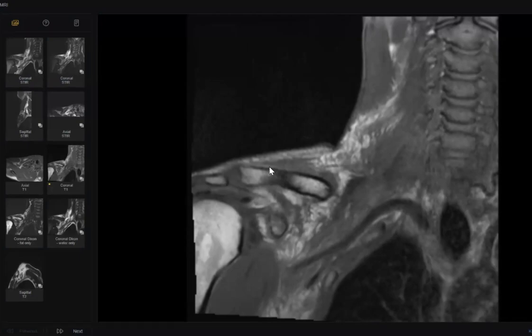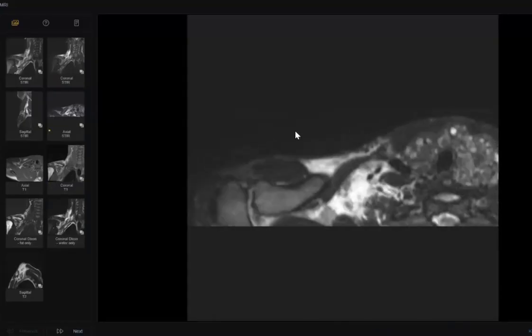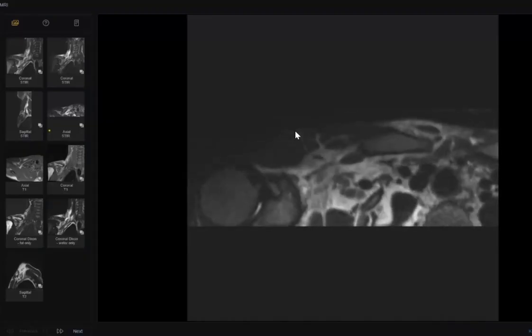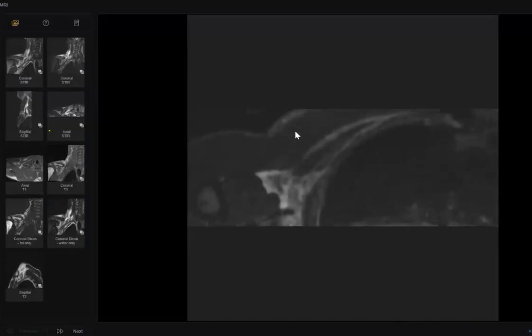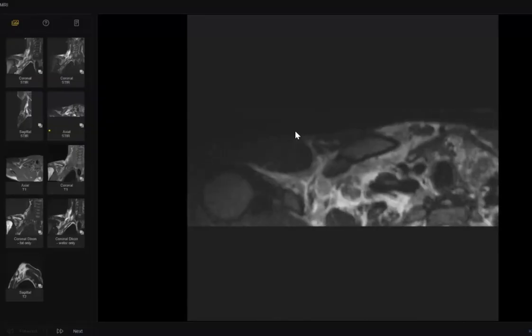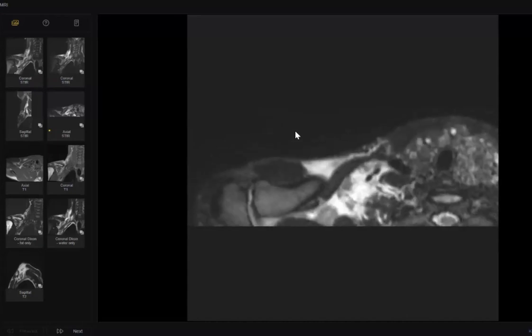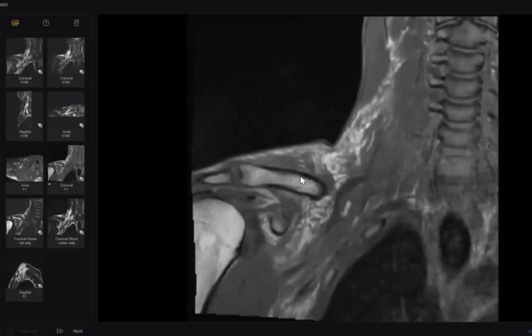Do you have axial STIR images? This is axial STIR. Yes, I can appreciate that in axial STIR also the lesions are not suppressed. It is hyperintense in axial STIR. So in my routine practice, I would ask for the history and compare with the previous images. The appearances may be keeping with some soft tissue sarcoma or any insinuating lesion. What will you do next?